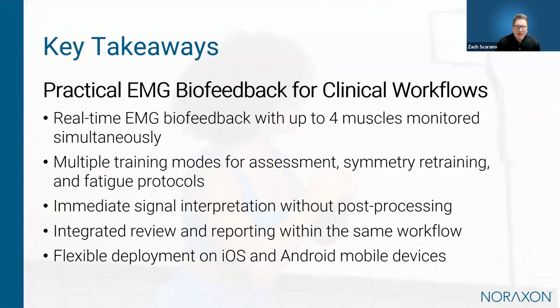The app supports several different biofeedback approaches, as you saw, including real-time EMG monitoring, the template-based symmetry retraining, and then the structured work-rest protocols for fatigue and endurance training. And so together, these tools allow users to utilize EMG biofeedback not just for measurement, but also as a powerful training and rehabilitation tool.